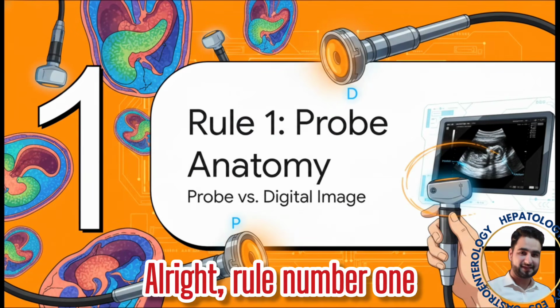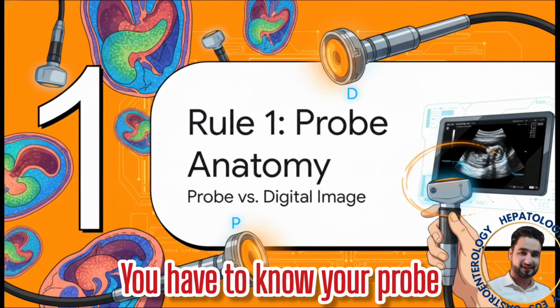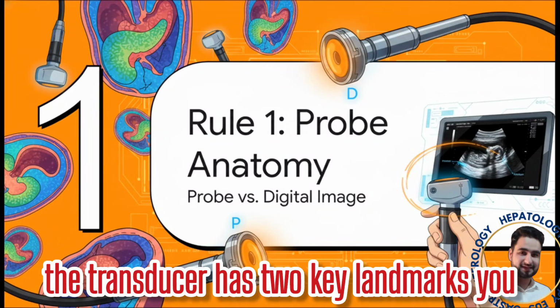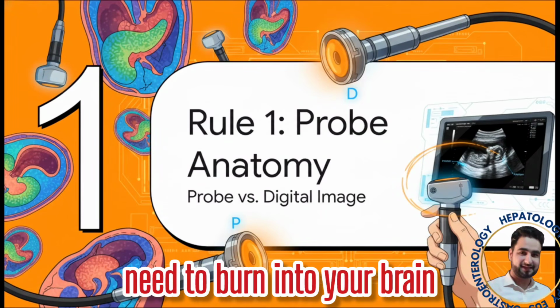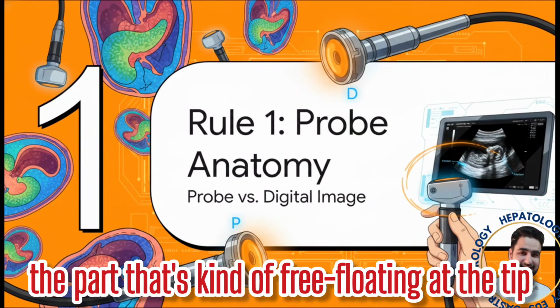All right, rule number 1. It all starts with the tool in your hands. You have to know your probe. At the very tip of your echo endoscope, the transducer has 2 key landmarks you need to burn into your brain. The proximal end, that's the part closer to the scope shaft, and the distal end, the part that's kind of free-floating at the tip.